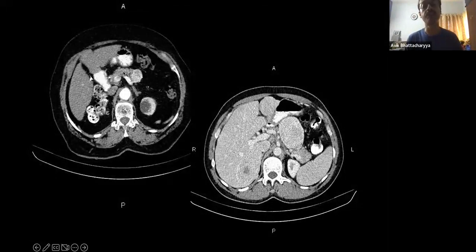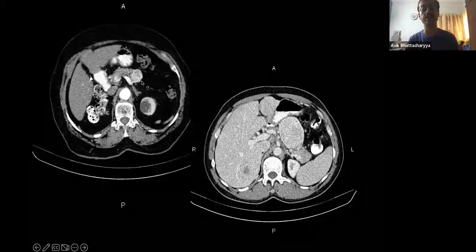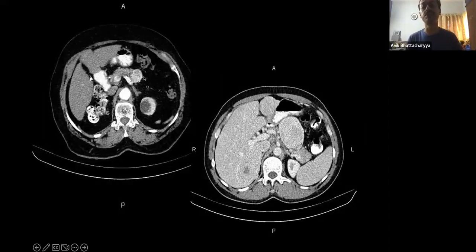You can appreciate this is the rest of the pancreatic parenchyma, which is not enhancing. But this lesion, although it is also having a contour bulge, is a mass lesion, bigger than the normal width of pancreas, and it is also enhancing on late arterial phase of contrast study. If we see this type of image, we are very sure we are dealing with a hypervascular tumor of pancreas.